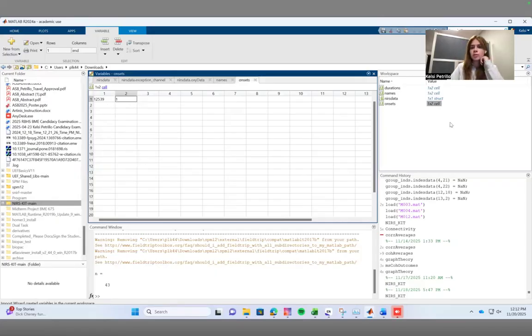And that pretty much sums up how to do the pre-processing in NIRS KIT. I'll have some additional videos on how to do post-processing in NIRS KIT. But like I mentioned, the user manual is a really fantastic tool. I highly recommend that everybody refer to it for any questions, complications, or just better descriptions of what's actually happening with the data in NIRS KIT.